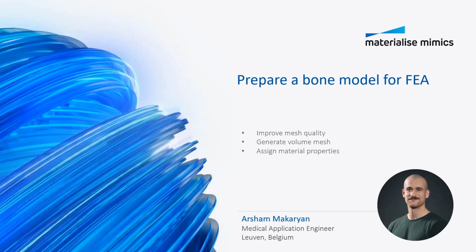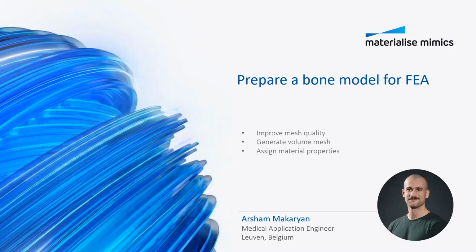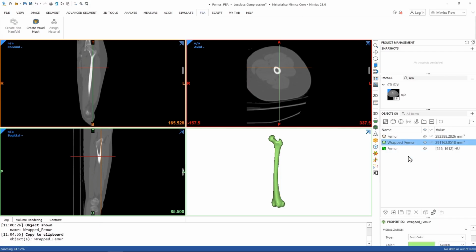You will learn how to mesh a 3D model in 3matic and then how to assign material properties to it in Mimics. We start with the femur FEA file in Mimics Core, and then here we copy the wrapped femur object and paste it into 3matic.